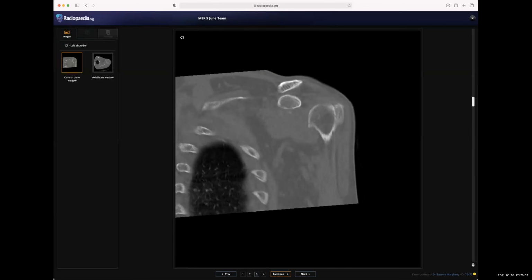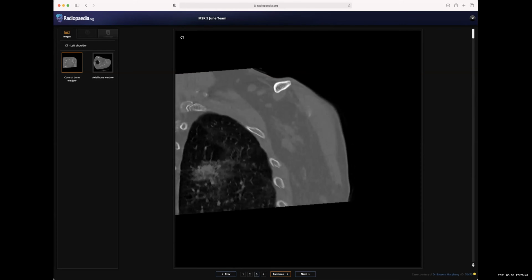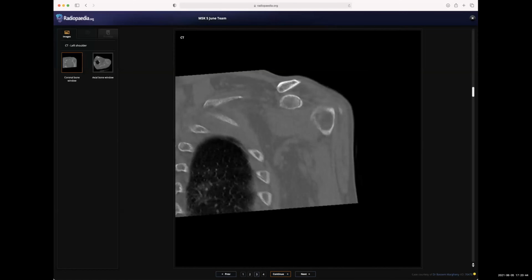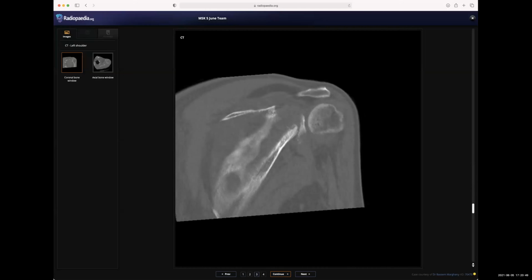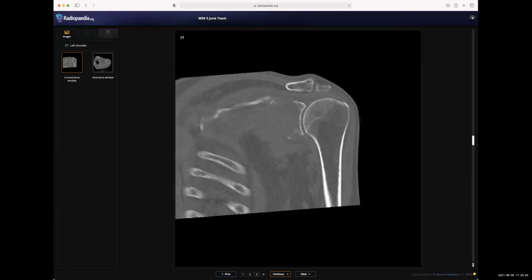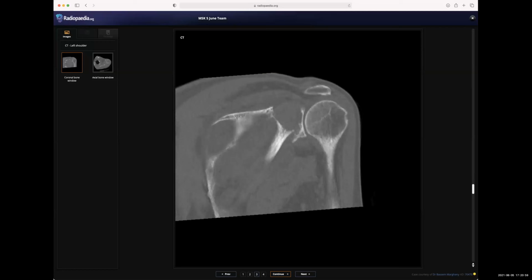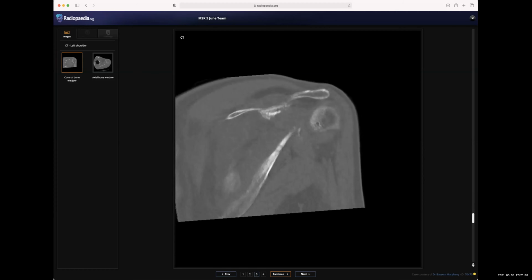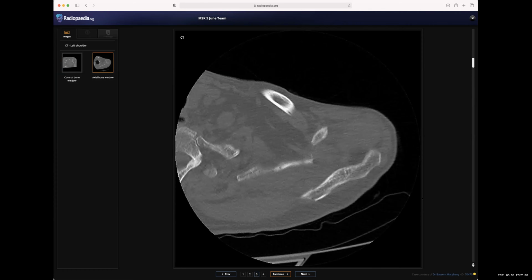Okay. So I'm looking at the CT shoulder at the moment, and as you said, the chest just has sort of airspace disease or consolidative changes. Here, the scapula and the part of the glenoid is almost what we would call vanishing. So the other differential here could be Gorham's disease, the vanishing bone disease. That would be my second differential after the exclusion of metastatic disease. Okay. Next, please.